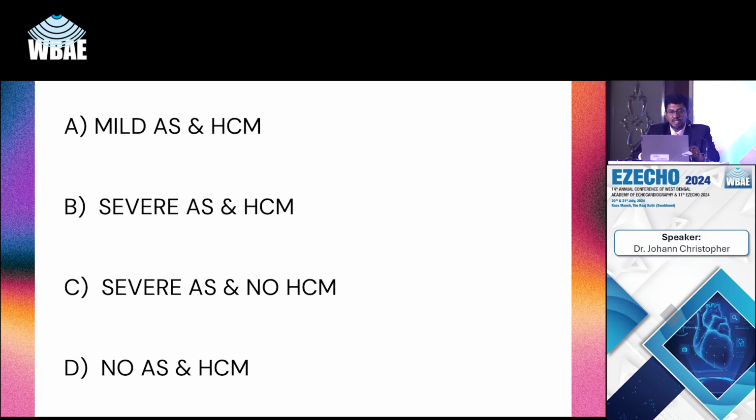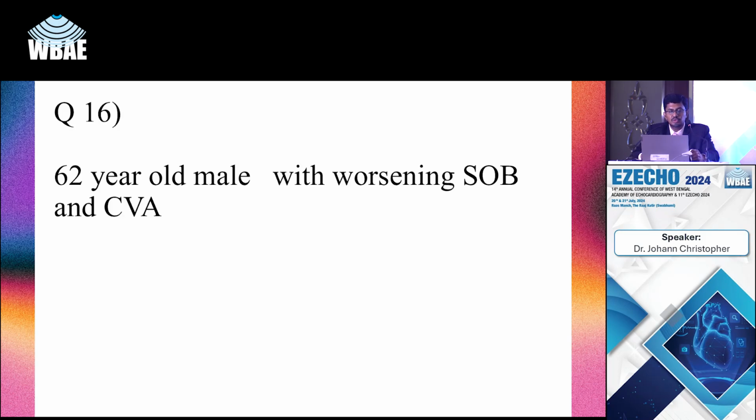So the leftmost picture is showing you the valve. It's pretty straightforward even on the base image. And the rightmost is showing you the pathology. The red arrow is pointing to it. Patient came with a stroke. So the answers are bicuspid aortic valve and a penetrating atherosclerotic ulcer. 2 is a tri-leaflet valve and a PAU. 3 is a calcified aortic valve, and 4th is an aortic aneurysm. Patient came with a stroke.